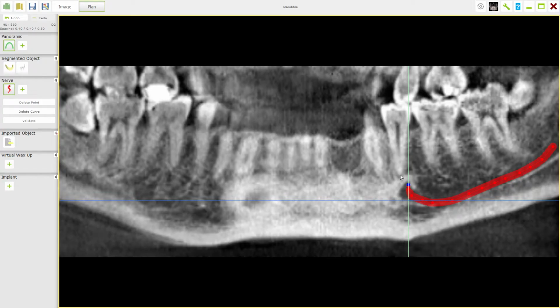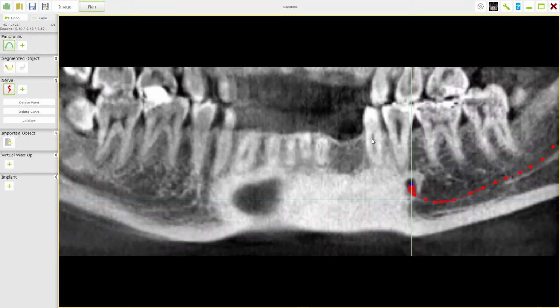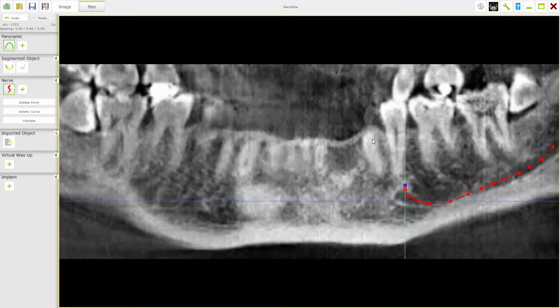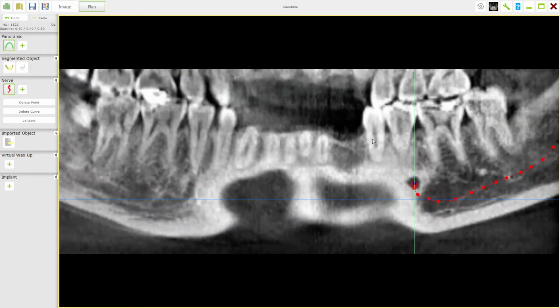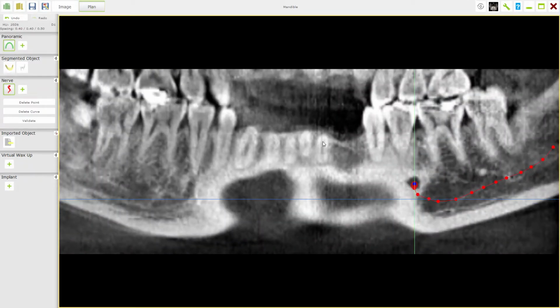Yeah. So now we can see the nerve that we've traced out, we can see it coming out, the relationship of the nerve to the apex of the lower left 5, the different relationships back here, and now this is our canine, and I can turn this to our first premolar, and this is the sort of place where we want to be positioning it. So I can see the root of the lower left lateral, and this is more of a view of our first premolar.